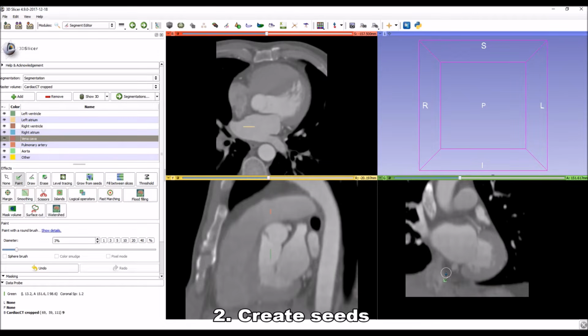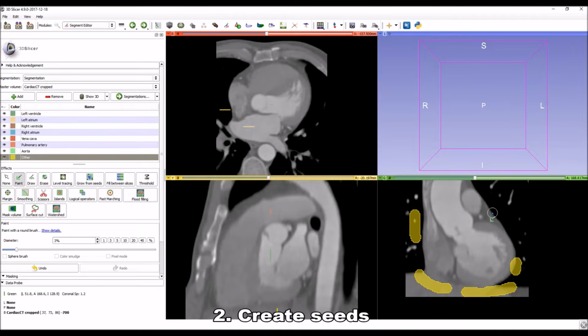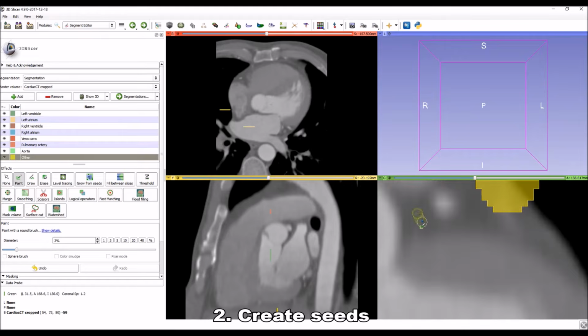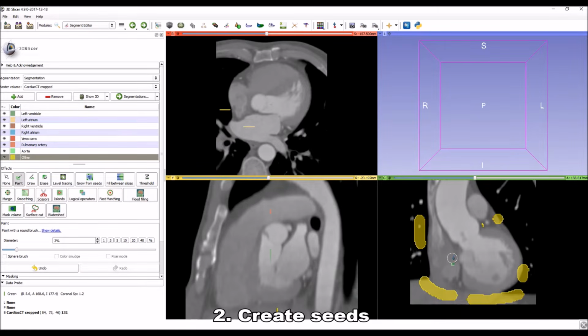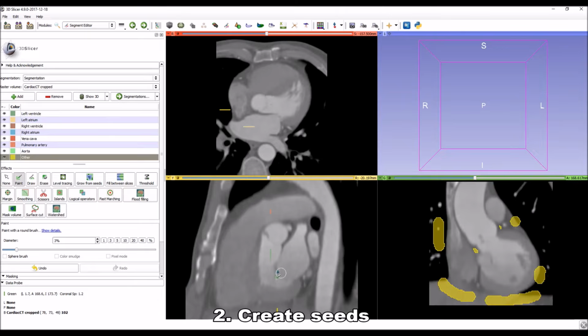It's kind of visible there. The last thing that I have to add is all the other segments, so it's outside all the ventricles and vessels. So even the heart muscles are in the other category, because we are interested in the ventricles and vessels and not in the heart muscle itself.